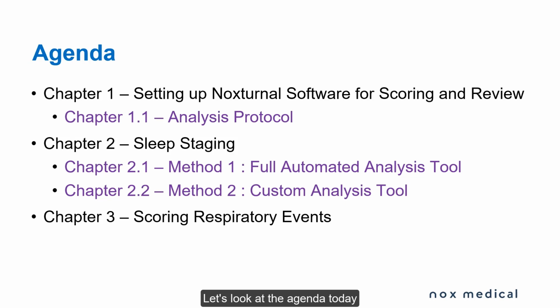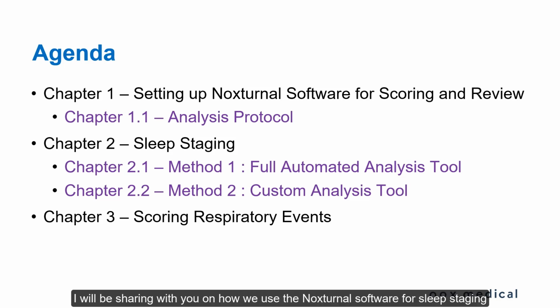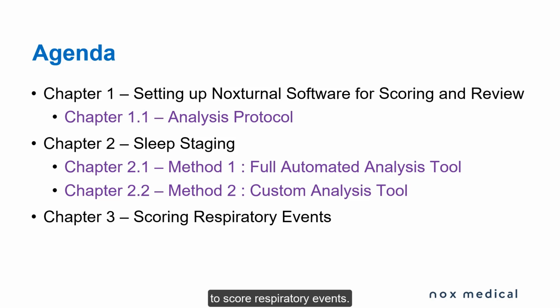Let's look at the agenda today. In Chapter 1, I will be sharing with you how we set up the Noxturnal software for scoring and review. In the sub-chapters, we will be looking at the steps on how to set up the analysis protocol, and in Chapter 2, I'll be sharing with you how we use the Noxturnal software for sleep staging, and in Chapter 3, we'll be looking at using the software to score respiratory events.